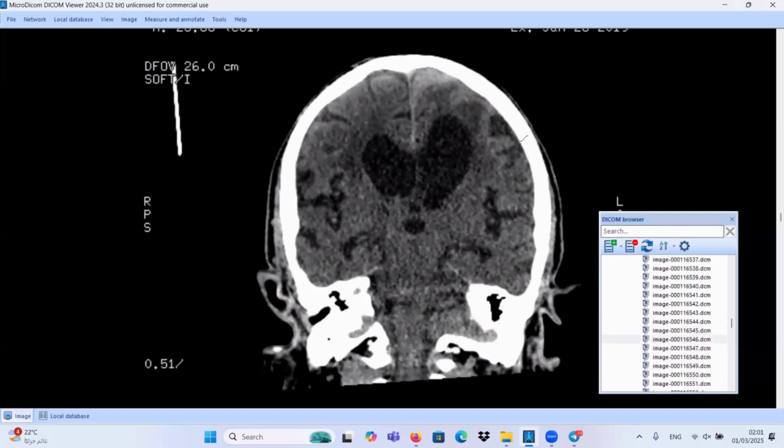My last comment here: if we have a hyperdense hematoma, we will diagnose it as acute subdural hematoma, but take care. Sometimes patients are anemic, so don't expect the hematoma to be so hyperdense on the CT exam. Sometimes a subdural hematoma is isodense, not hyperdense, and at the same time it is an acute subdural hematoma.